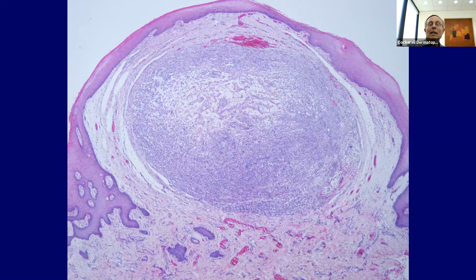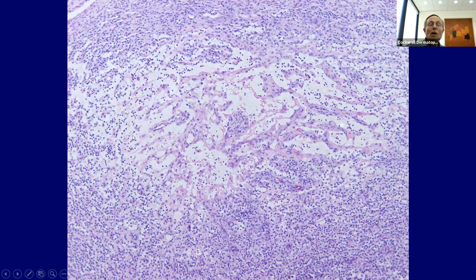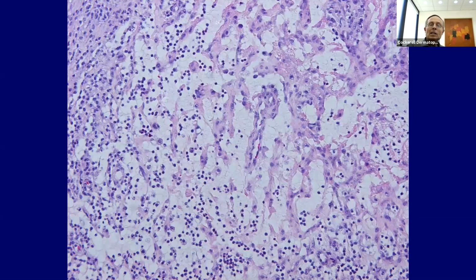So in the mucous membrane, I've got this well circumscribed area here, and as we go to higher magnification, it's got these dilated blood vessels, some inflammation here. And then if you look in the center over here, it's got this, again, bluish gray material with these blood vessels that have formed with some granulation tissue. So what do we know that occurs in the mucous membrane? It occurs like a little translucent papule. You biopsy it, and it looks like this. Yeah, a mucocele. And basically, this is really more kind of a ruptured mucocele.